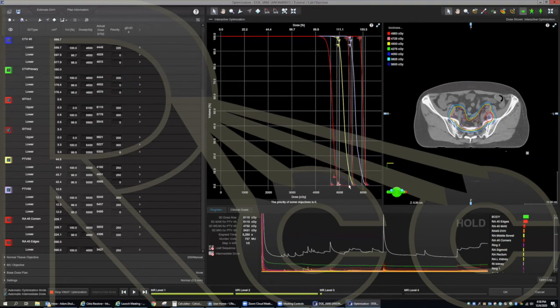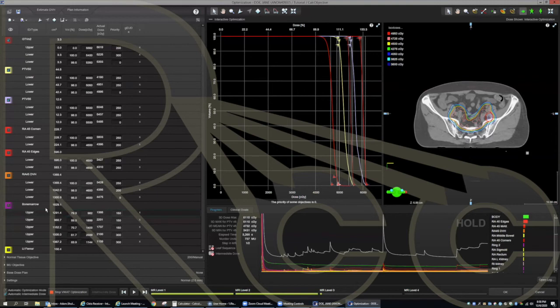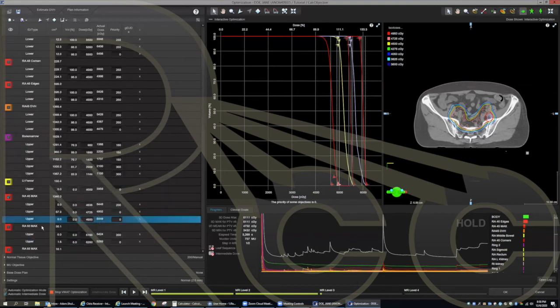Here's that 45 max. See, it's just got this tail. Let's knock it down around here, right? I just turned them off so that you could see what I was looking at. That's my 45 max. And I'll put a big priority and just knock out that tail. I can put a priority on this that I didn't have before.